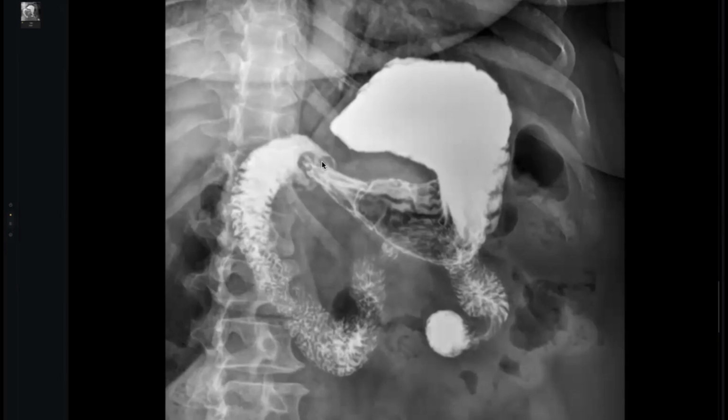And then give the examiner your differential diagnosis: mass, lymphoma, ulcer. Not ulcer. Don't tell us ulcer. An ulcer is a pouch filled by contrast outside. A diverticulum is also a pouch filled by contrast, but differs from an ulcer in that its margin is highly smooth, completely smooth, and the mucosa is normal.